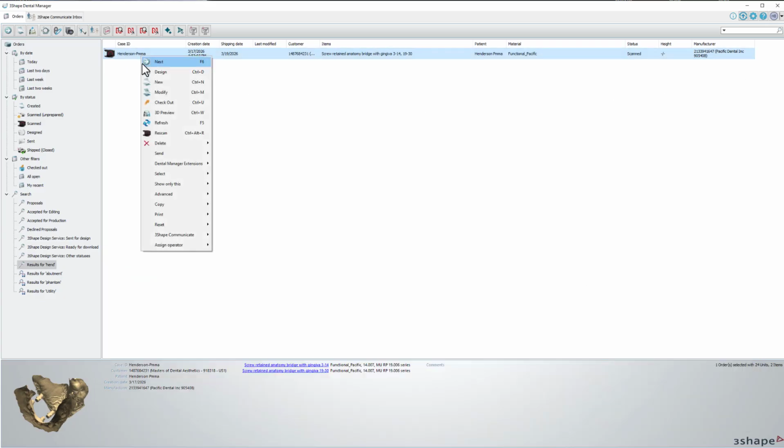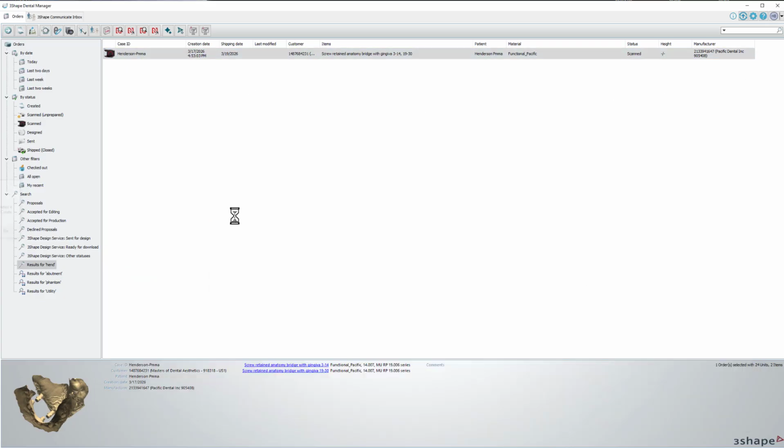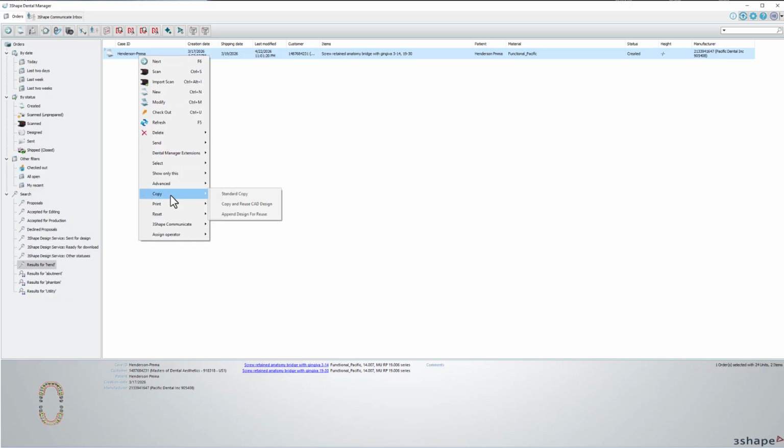Basically, we're going to reset the case to created. Now, I have this case here. This is the order. So this is the final order for the PMMA, and we're going to basically bring everything together into one right now. And obviously this is taking, okay, here we go.